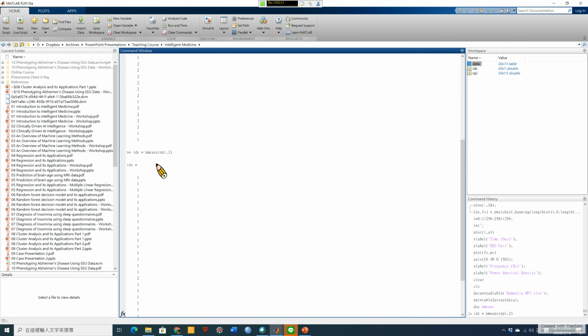So you can see that the cluster analysis does not have any prior knowledge of which cases should be classified as the first cluster or the second cluster. In the first round, these cases are classified under the second group, but in this case they are classified in the first group. So there's no reliable way if you are just using K-means; you need other methods, for example K-means plus, to derive a more reliable solution.